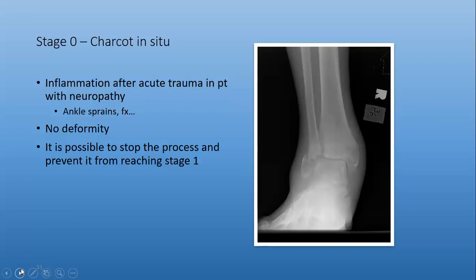Good. And so I have a medial oblique view, it looks like, of the ankle. And most notably, I see a fracture of the fibula, of the lateral malleolus, around the Weber B level. Okay. And also a possible chip fracture of the medial malleolus, the distal aspect of the medial malleolus, so more at the epiphysis of the tibia.